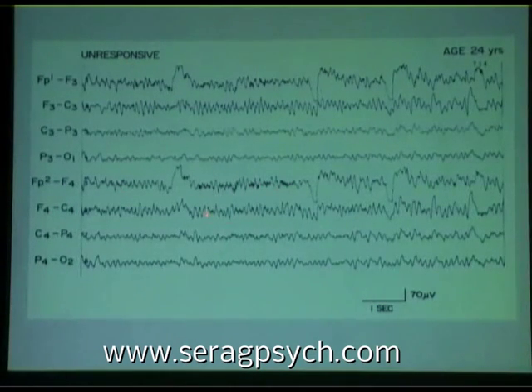And she has these rhythmic waves. They look like a medication effect, don't they? But that's not what her background activity shows. So this is a new thing. Notice that these things evolve a little less quickly in the generalized than in the focal, but she's going on in this, and then next.